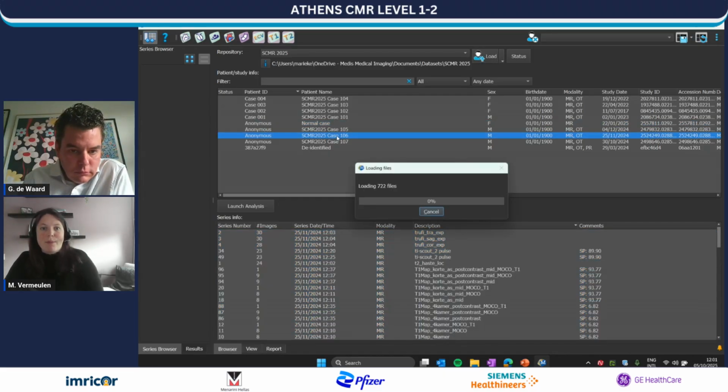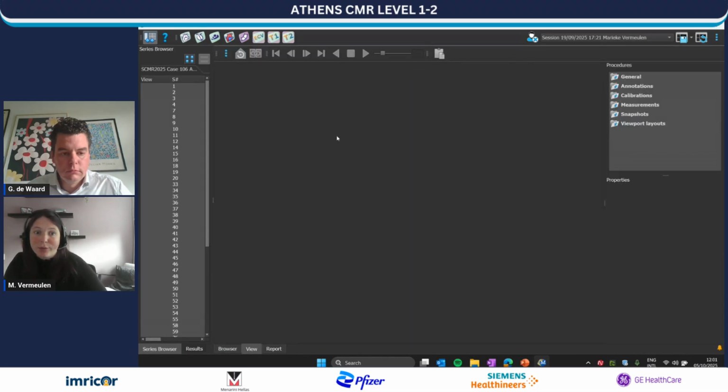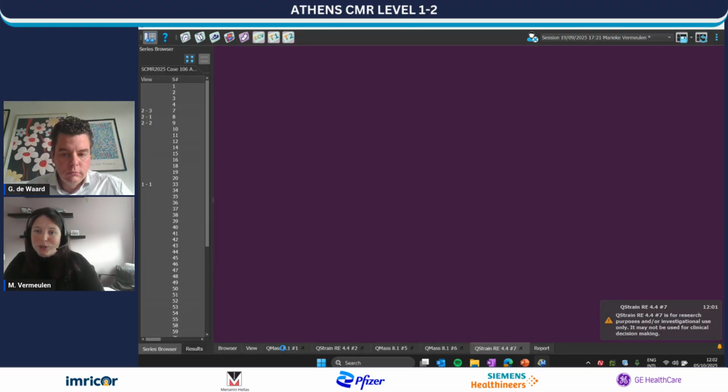Yeah, so just opening up case 106, which corresponds to the case that Dr. De Waard has just been introducing. So while we're opening up the case, again, we will see that QMass and QStrain will open. So first, we'll open up the QMass instance, so we can have a look and discuss the volumetric assessment of this patient.